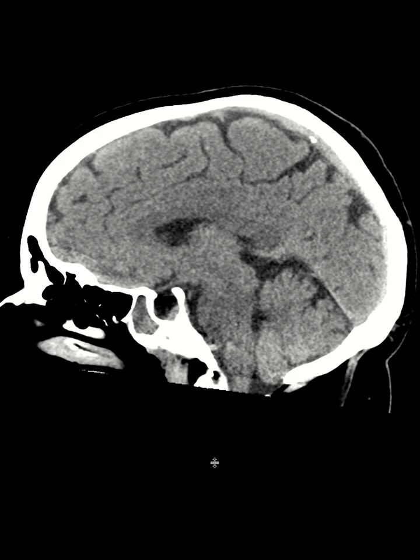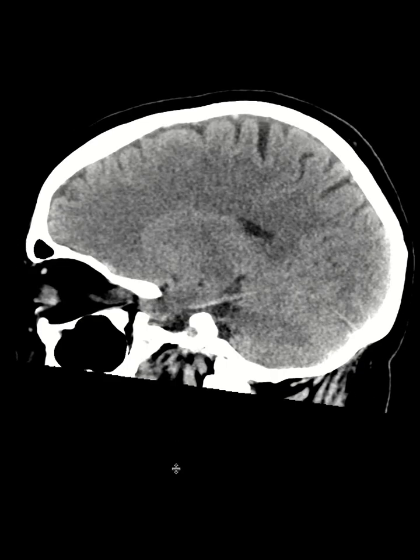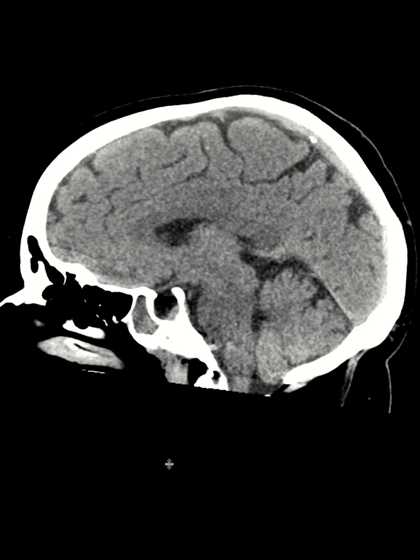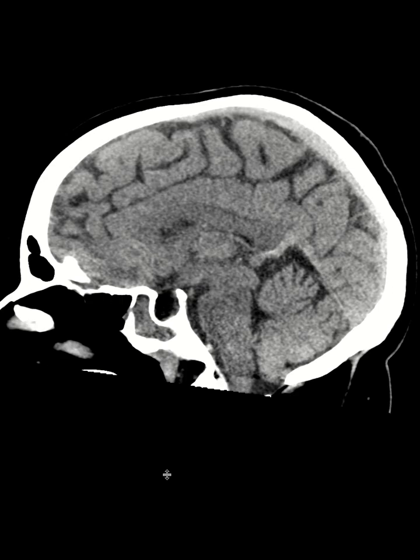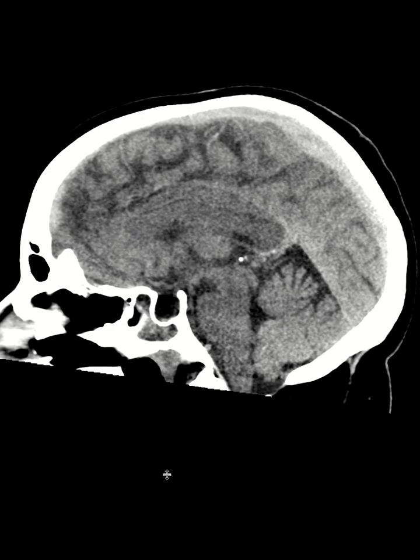The important lesson from this as radiologists is that we are not just looking for the cause that the patient was sent to us for. We look at the patient as a whole. This patient presented with a traumatic injury. They were looking for a bleed, intracranial hemorrhage, or a calvarial fracture, but we see something beyond. I think that's the beauty of radiology, and that's the art of a radiologist, to look at everything, look at all the imaging features, and provide the essential diagnosis that actually changes the patient's life.